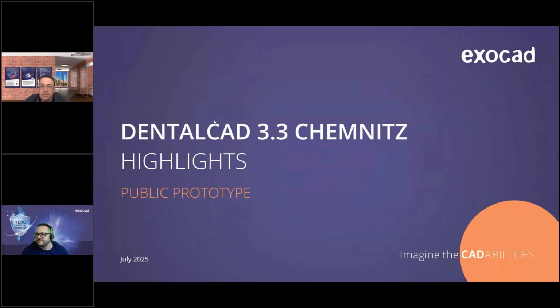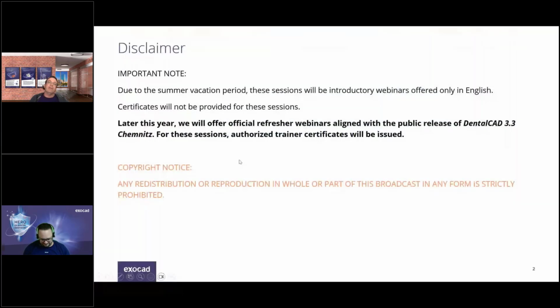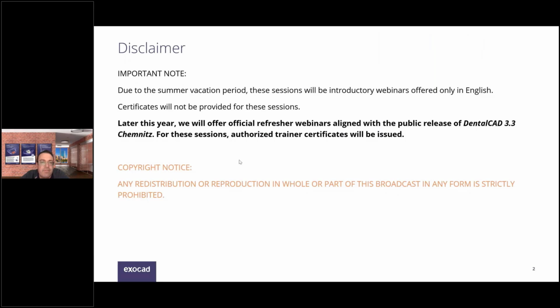So we have quite a lot of information to go through. This is an introduction webinar, so this is a shorter form. We're going to go through most of the new features of the software, and we're going to have the official longer form training webinars once the public release comes out in a little while. Those will be the ones that you'll need to join for the authorized trainer certificates. But this one is just to get you up and running. We have the public prototype version out there, so this is just to get some introductory information about the features so you can start using it right away and testing it and giving us some feedback about it.